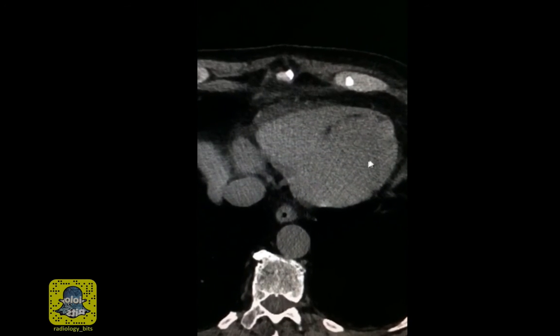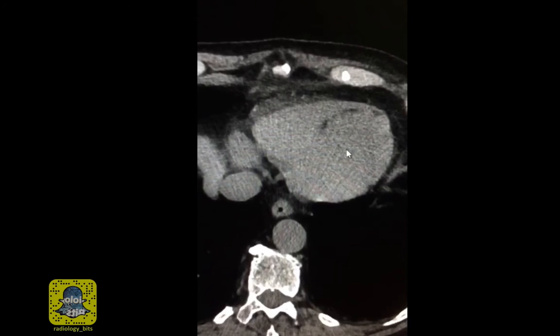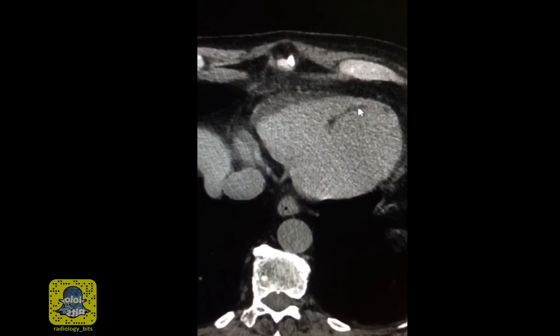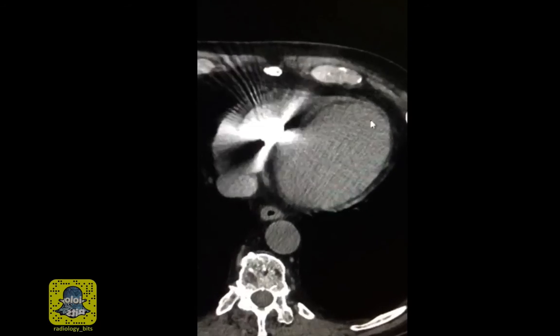This is the location of a dilated left ventricle, and this is the location of a right ventricle. Normally, without IV contrast, you cannot differentiate both. However, here you could differentiate by this hypodense line. So let's look at this linear dark structure here.